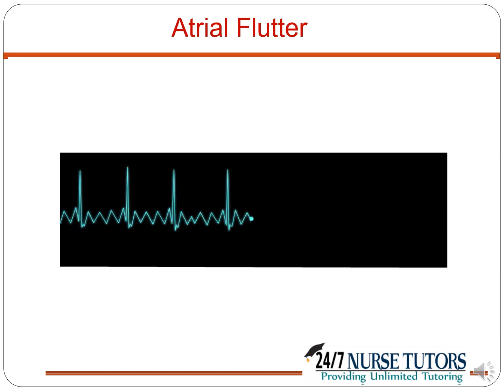In atrial flutter, there are flutter waves. The rate of the flutter waves can be 250 to 350. The ventricular rate is often between 150 and 170. There can be variable conduction, 2 to 1, 3 to 1, etc., meaning there are 2 flutter waves for every QRS, etc. The QRS is normal.